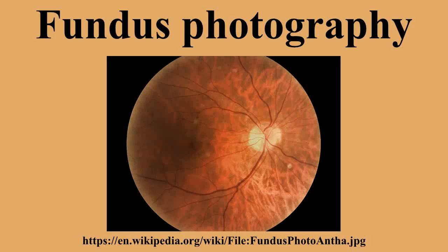Angiography is a process of photographing and recording vascular flow within the retina and surrounding tissue by injecting a fluorescent dye into the bloodstream. This dye fluoresces a different color when light of a specific wavelength reaches it. Barrier filters then only allow the fluorescent wavelengths of light to be photographed. Using this method, a sequence of photographs can be produced that show the movement and pooling of blood over time as the dye passes through the retina and choroid.